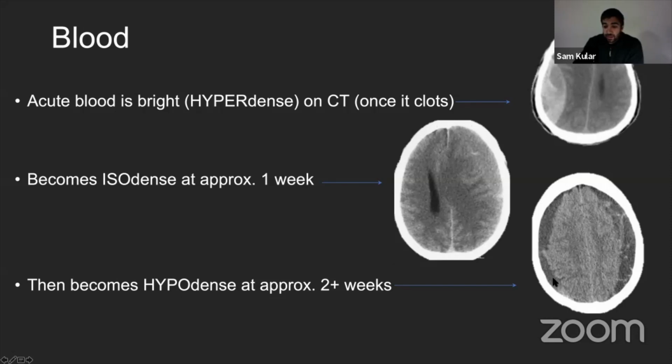And so it's a lot lower or darker than the adjacent brain. And therefore you can see that these are now chronic, and these are not active bleeding, but they have matured and now are chronic. And it's hard to say whether these are 2 weeks old. Some patients will walk around with these for years and not realize if they're not causing any significant problems.